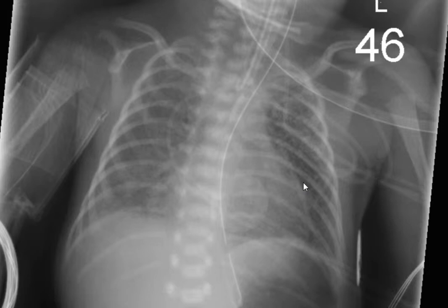And the only reason why it's important for us to diagnose it at this level is that if they continue with conventional mechanical ventilation in the face of interstitial air, it's just going to set up a vicious cycle of the lung getting less compliant, so they have to deliver more pressure, and you eventually end up blowing out the lung and getting a pneumothorax. So if we can pick it up early like this, they will usually change the baby to a high-frequency ventilator, which causes less of a pressure effect on the lung and decreases the risk of pneumothorax, as well as intracranial hemorrhage, which is a common complication of pneumothorax or tension interstitial emphysema.